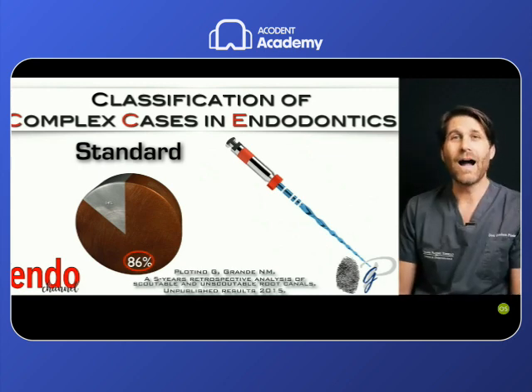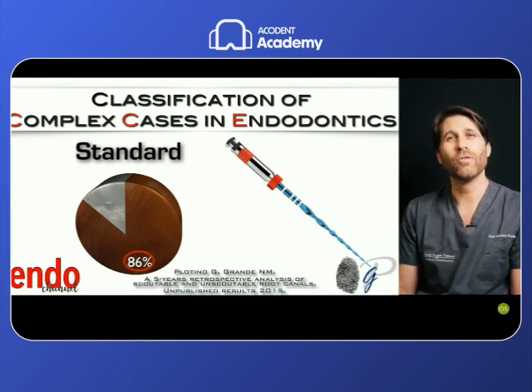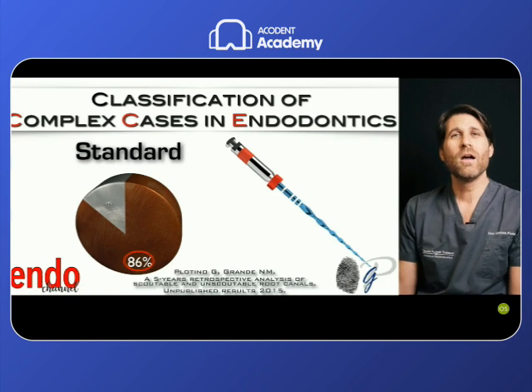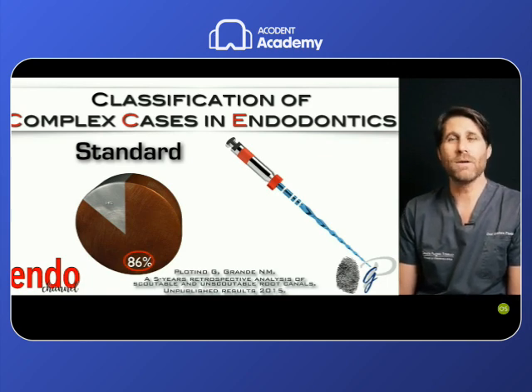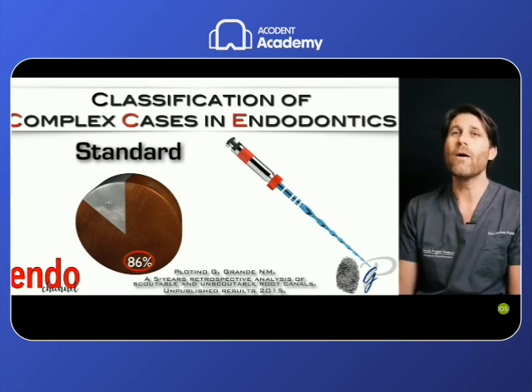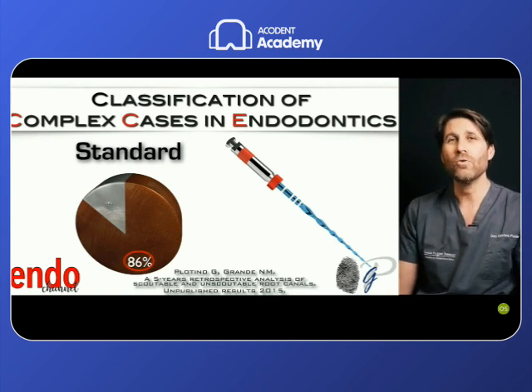only after the scouting or without any scouting, as we have seen in the lesson on the root canal preparation, because this file aims to prepare the coronal and middle third without any glide path. So we can start directly with this file, and we need a scouting and glide path only in the apical third. So with this instrument, we can use different strategies.